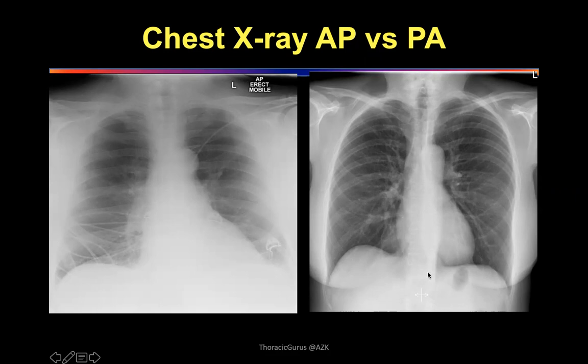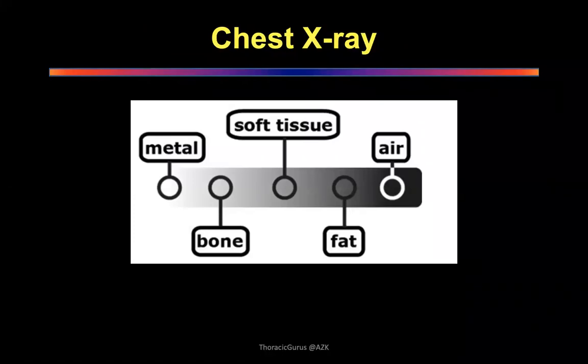Whereas here, you can clearly see that lung coming anterior. You can see the superimposition of the image. You can see the diaphragm very sharply. Can you appreciate the diaphragm can be seen? The left diaphragm can be seen all the way up to the midline. On this side, you cannot see the left diaphragm clearly because it forms a very dull image. And hence, the best image to take is a PA view. Okay. All right. Is this clear to everybody?